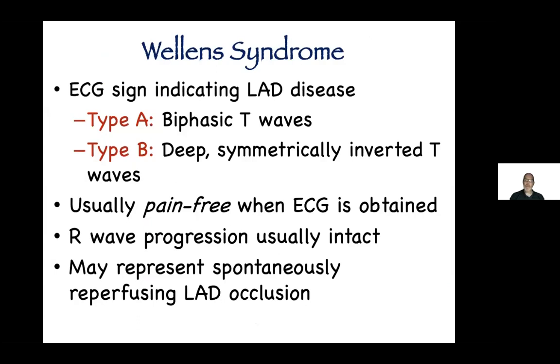All right, a couple of things I want to go through here real quickly. I know I've probably gone over my time, and if I have, I apologize. A couple of things that are considered to be, this would not be considered a STEMI equivalent, but it's telling you there's something going on with the patient. It's called Wellen syndrome. It's an EKG that indicates LAD disease.